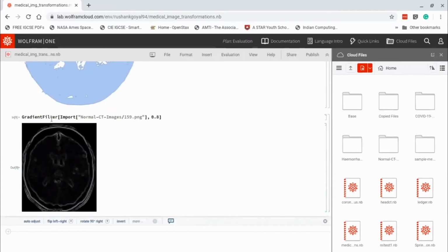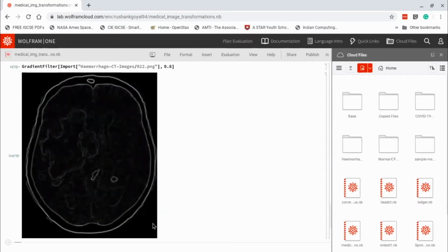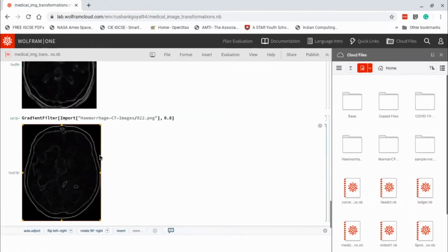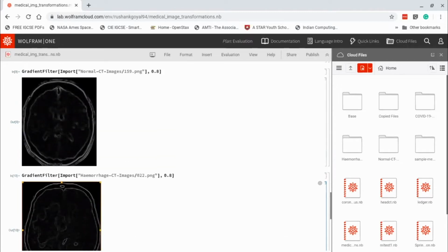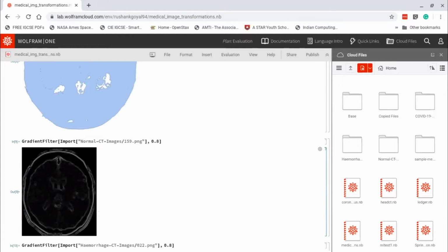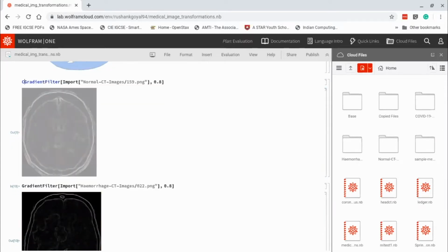And let me just copy paste that for the other image. Okay, so here, there are some differences, but they're really not highlighted, and even if you were to see them yourselves, or any algorithm, it would be really hard to tell. So this is basically just making the algorithms work harder, which is not what you want to do. So you apply this other function, color negate.